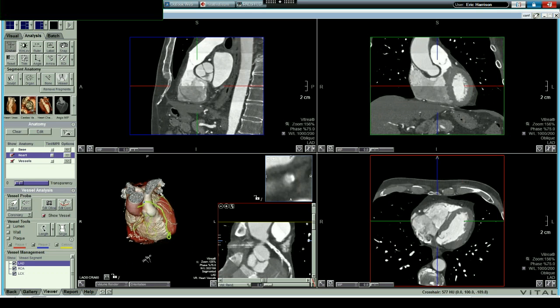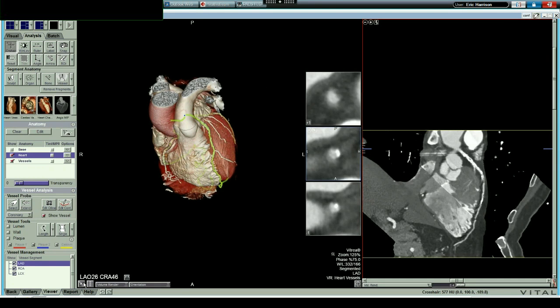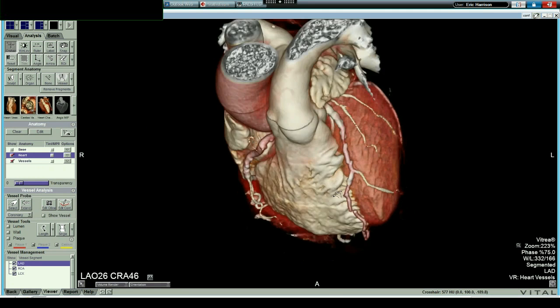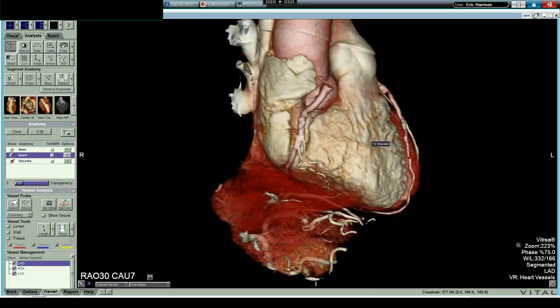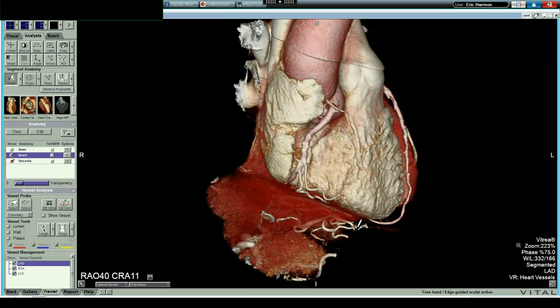And so here we are at our cardiac CT, which you recognize right away. This particular image is always very exciting to people to see this volume rendered image of the heart. And we like to look at the volume rendered image and to manipulate this particular image because it looks so much like a 3D model of the heart.